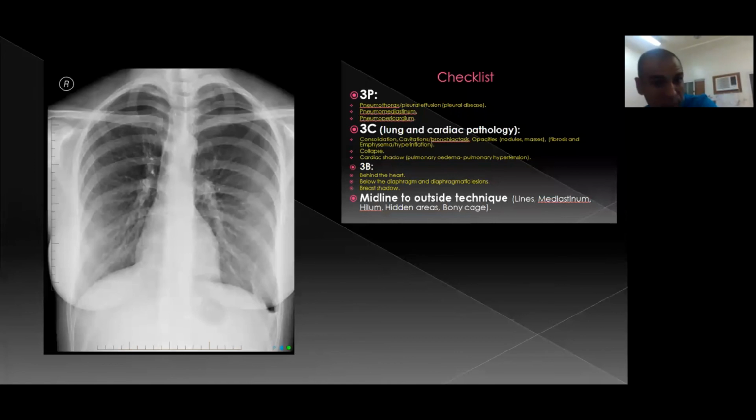Left pneumothorax, Dr. Muhammad. You are right. Well done. I get it because you asked for surgery. I thought it's something surgical, not medical. Yeah, you are right. This is collapsed lung, and this is the visceral pleura crossing the rib, as we discussed in the first part or first session.